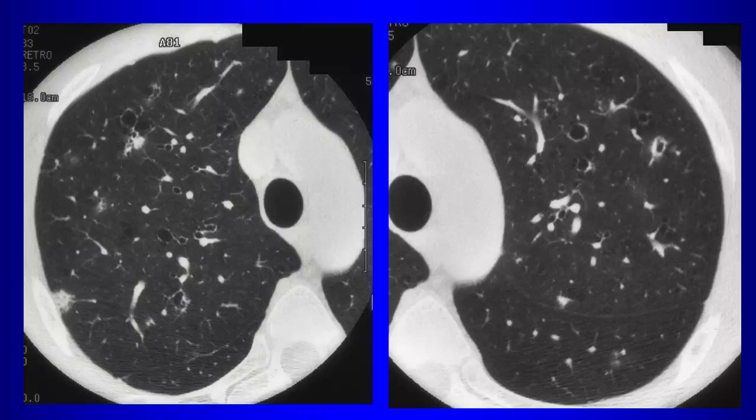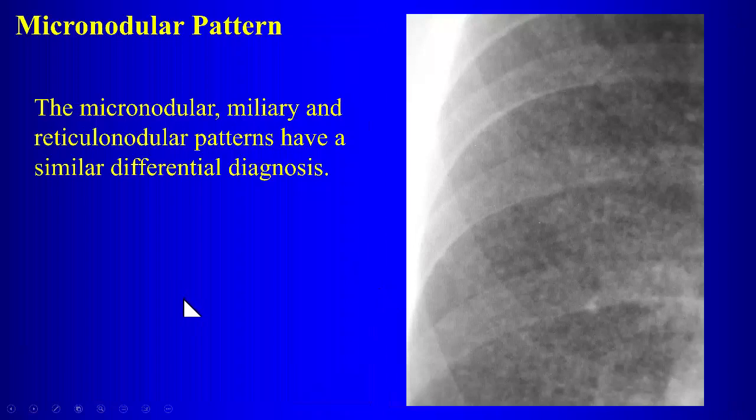What'd you say? No, the halo sign is ground glass around the lesion, okay? That's not this. Nobody? It's called the Cheerio sign, because it looks like a Cheerio, right? Of course. I guess you're all Captain Crunch fans.